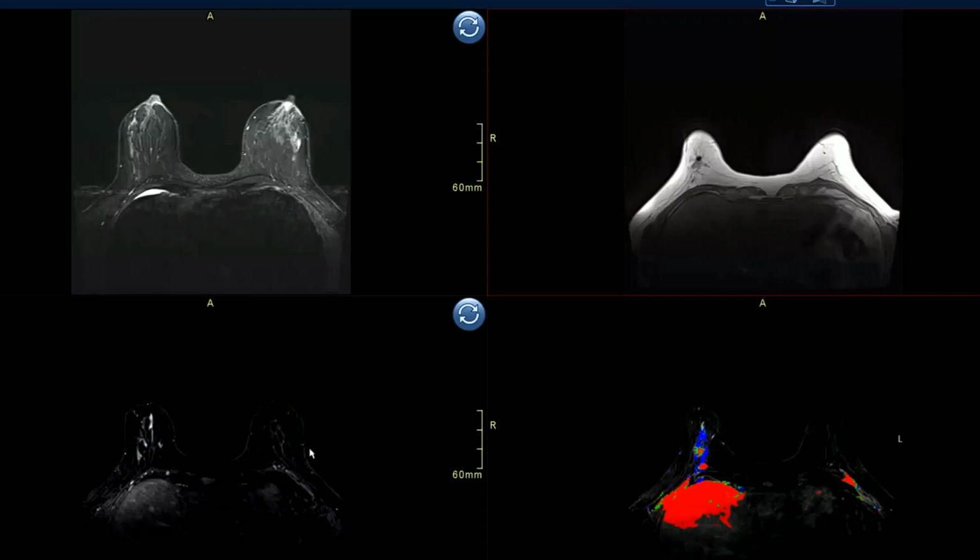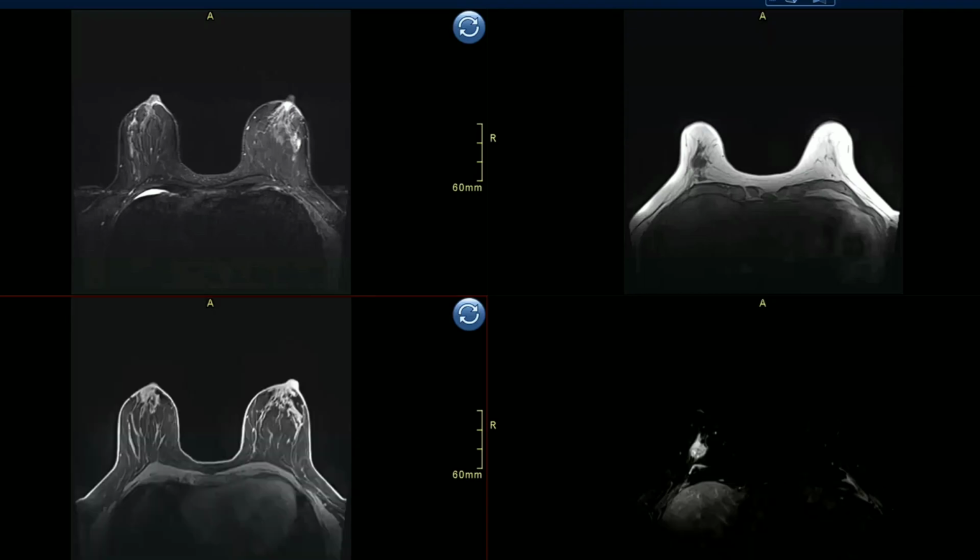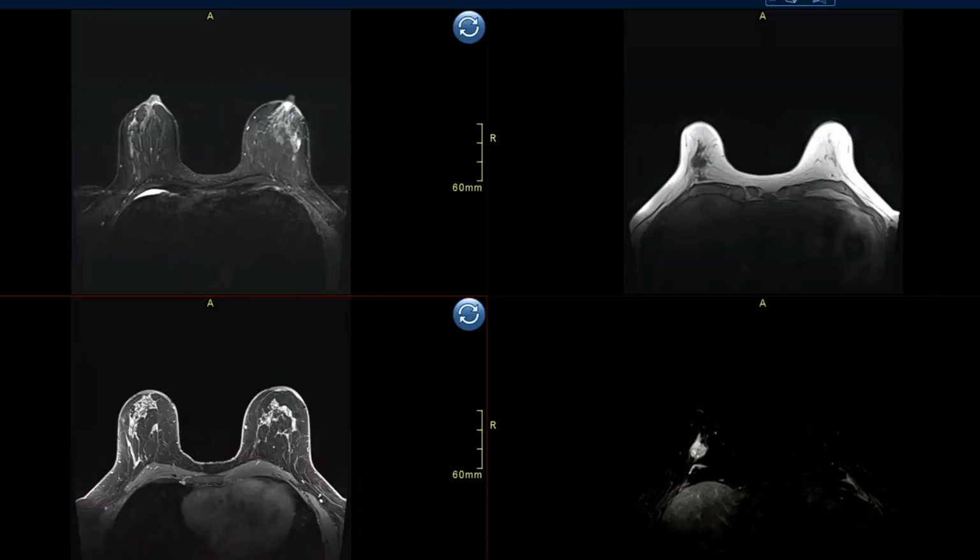So this is a pre-contrast. You take an image before you give the contrast. So this is pre-contrast T1. And then this is the post, and this is the same. Now they've given contrast. This is post-contrast. So you subtract this image, and then you get these subtracted images on which you should do all your evaluation, except the lymph nodes.